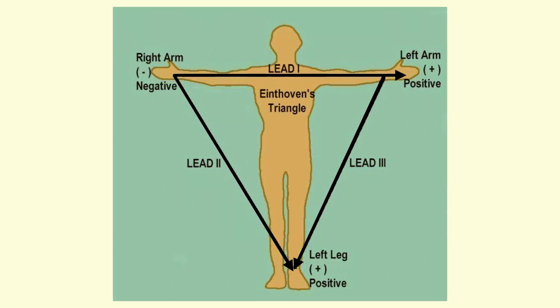And when I think about ECG, there's really two planes that are defined by the various leads. So you've probably seen a picture like this before, and an important bit of definition that sometimes gets confusing is that what is a lead actually? Well, a lead is this thing. It is the potential difference between the left arm and the right arm, with the left arm as the positive pole and the right arm as the negative pole.